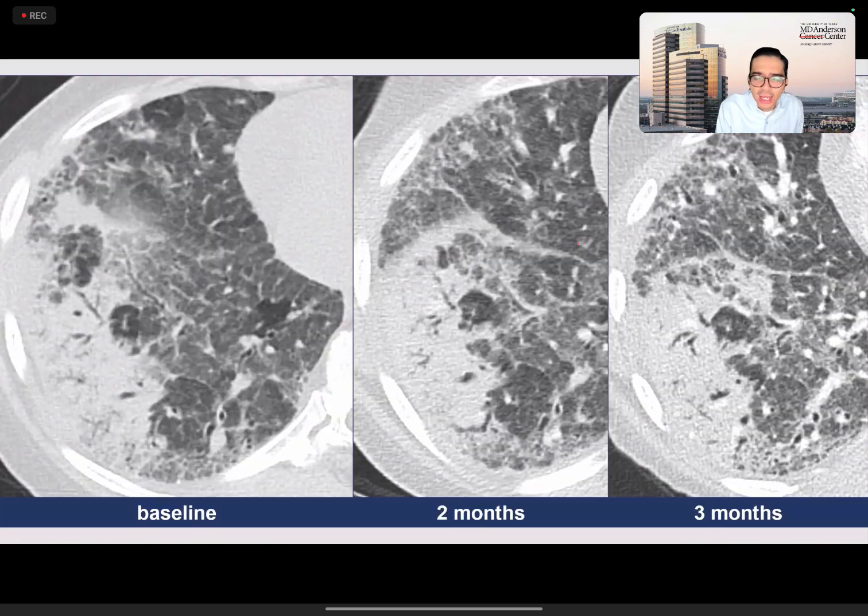And here's a patient who had interstitial lung disease. They had NSIP, and I think that was due to connective tissue disease. But in the right lower lobe, there was a more dense area of consolidation. And initially, we thought maybe this was a pneumonia. And so we said to follow it up. And at about 2 months later, you can see that it is still essentially unchanged. And at 3 months, it was still unchanged. Okay, so here in this case, at 2 months, I would raise the possibility that this is a cancer.